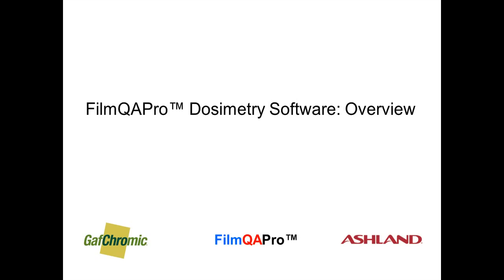This short tutorial provides an overview of the Film QA Pro radiochromic film dosimetry application and describes the structure and layout of the software, but not instructions for completing specific tasks like scanning, calibration, dose map calculation, etc. These tasks are described in other tutorial modules.